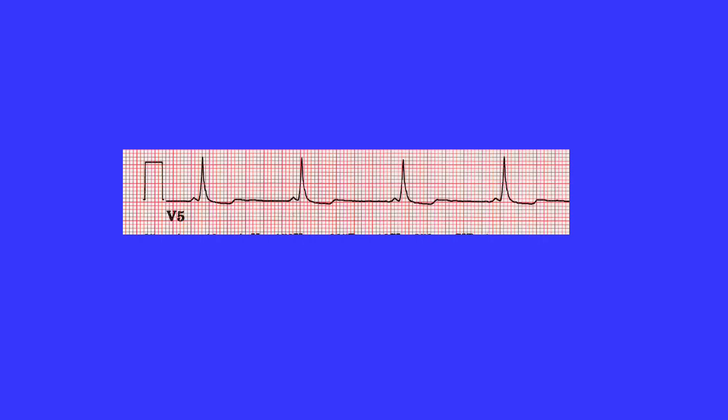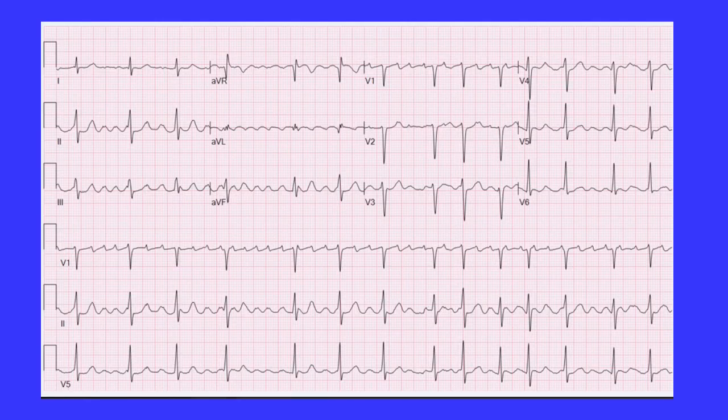What is the abnormality in this patient? This patient's PR interval is short, which is seen in pre-excitation. In this EKG, the P waves are replaced by flutter waves, and this patient has atrial flutter where the atria are fluttering.